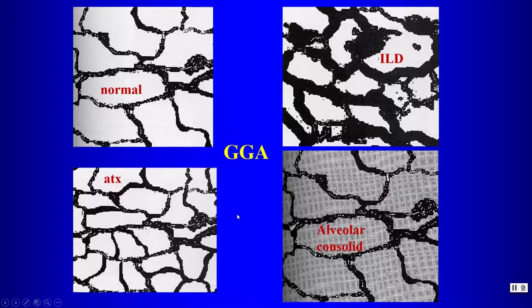Now, ground glass attenuation, this also merits a brief discussion. So what does ground glass mean?